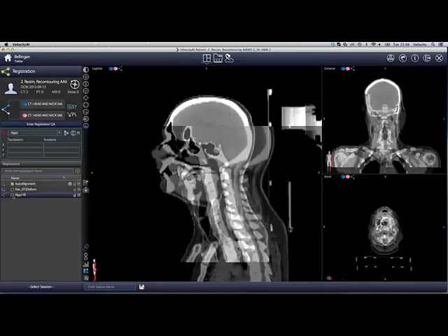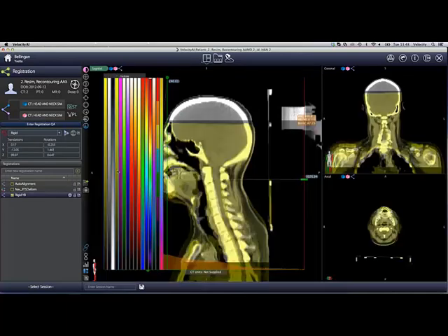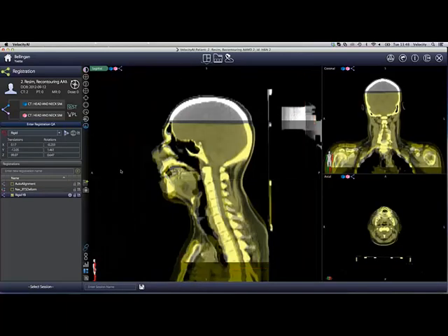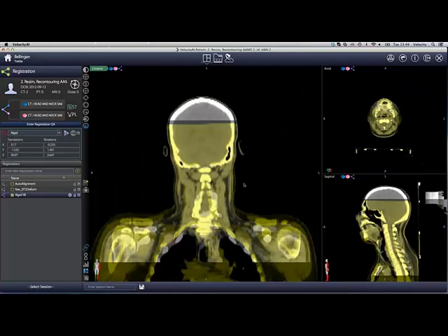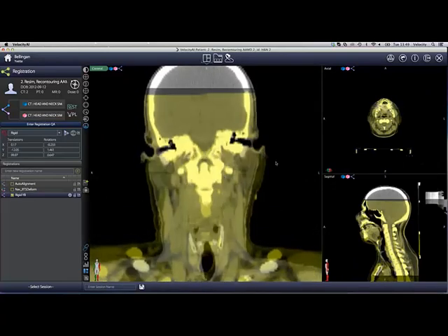So if we now enter our registration QA and have a look, you can now see this area, and I'm going to zoom in on the parotid that you can see. If you look at the back, the yellow might be a little faded, but you can see the direction that these vectors, these voxels have all moved.